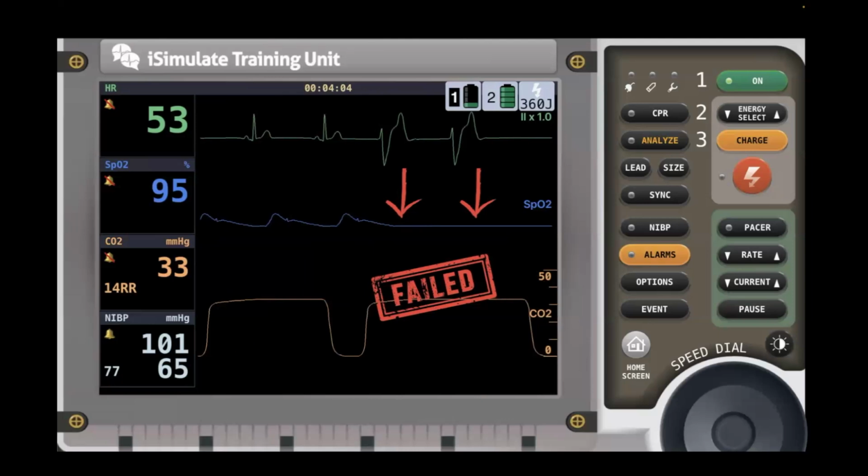How about this one? We talked about this in the last video. So we got P, QRS narrow, T waves recharging, sinus something, slow rate, bradycardia, but we have those extra beats that are out of cycle. In this case, they're wide and bizarre. So these are ventricular. And if we look over here, they have failed pulsation. That's a problem. Hey, take a look at this. Something's not right here, right? We have electricity, but we don't have mechanical function. Definitely one. So these are ectopic beats or PVCs that are not perfusing, non-perfusing ectopy.